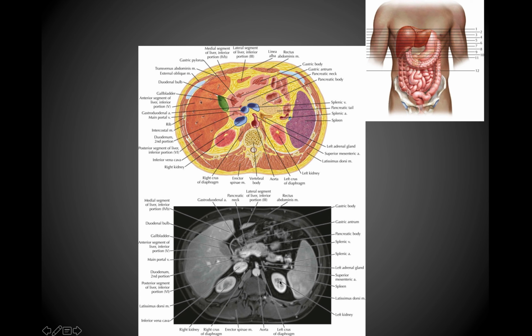You can see more of the kidneys now in this image. The IVC is also quite prominent, as is the portal vein, which you can see right here, and note the splenic vein again in close proximity to the pancreas. So you can see the pancreas cut across here, in between the liver and the spleen, over here on the patient's left.